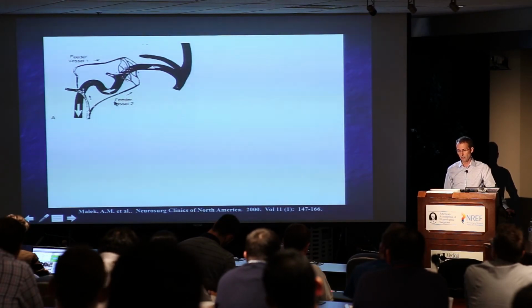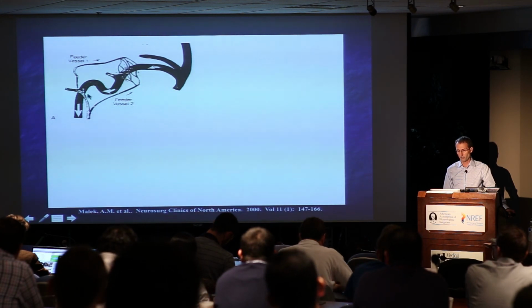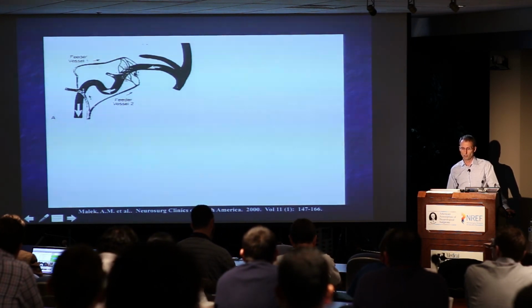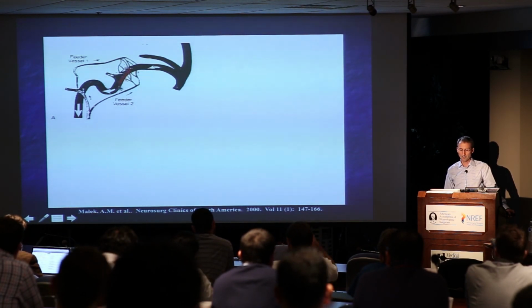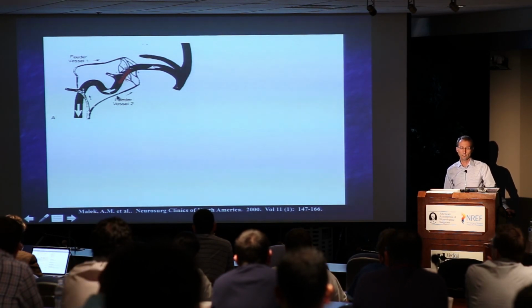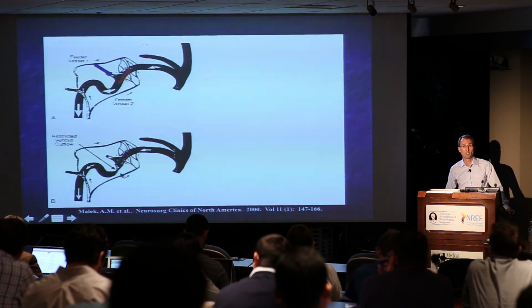But this is the same idea. Again, you can consider this being occipital feeders. This might be middle meningeal feeders coming to a dural fistula along the transverse sigmoid sinus. And again, in this case, all the arterialized outflow is anterograde down the jugular. This would be a low-risk situation. Well, dural sinuses and venous structures aren't really geared to deal with high pressure and high flow. And one of the consequences over time is often referred to as a high flow venopathy, where you can get progressive stenosis of the dural sinus, so just distal to the arterialized segment.